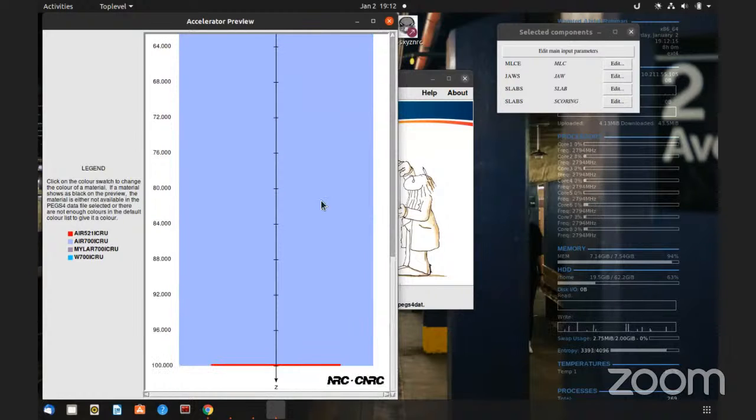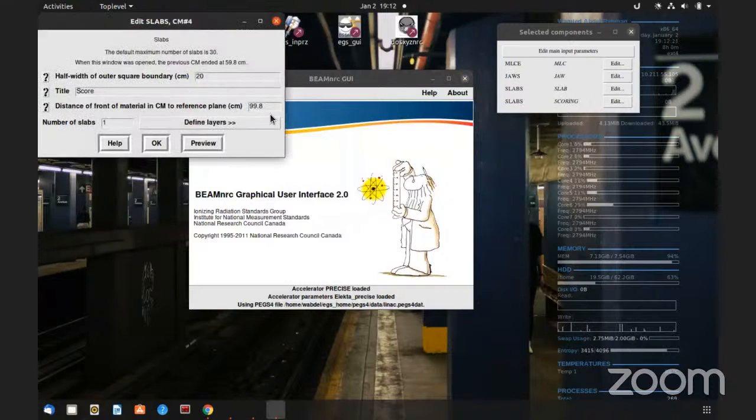Oh, because of this one, this is at 100. That's the problem, because this one is at distance. That's the issue. So that's why I would suggest you repeat, just remove this second slab in the component module, compile the Linux again, and that's what I would suggest.